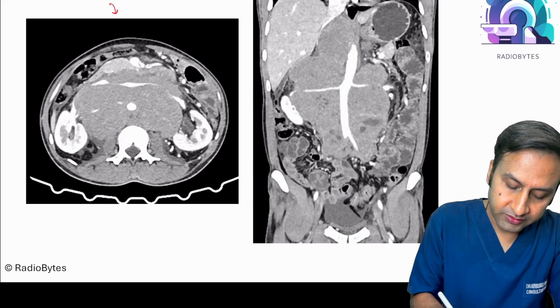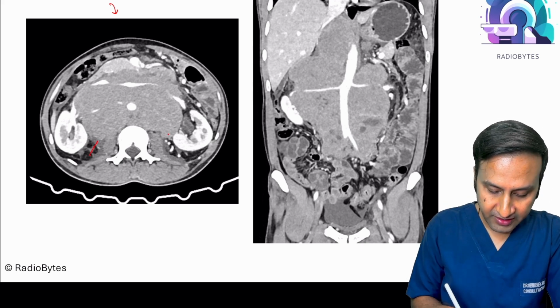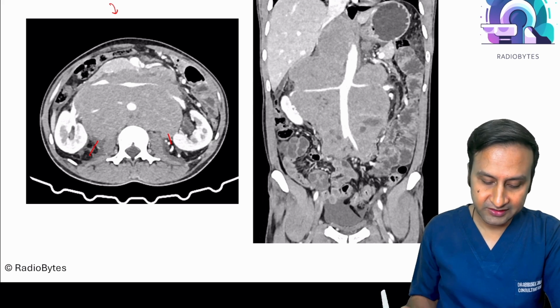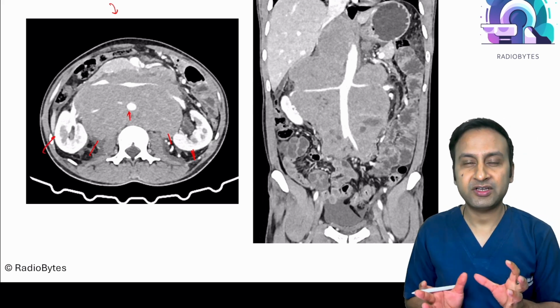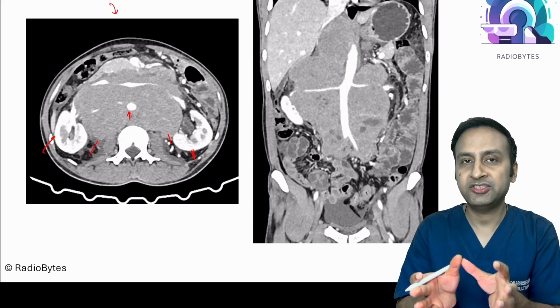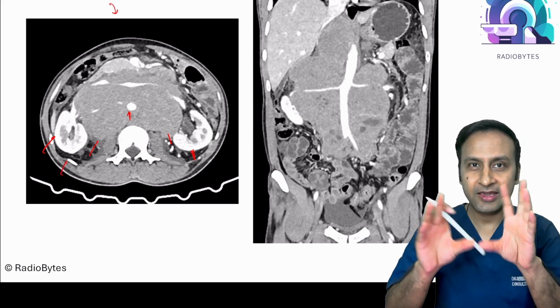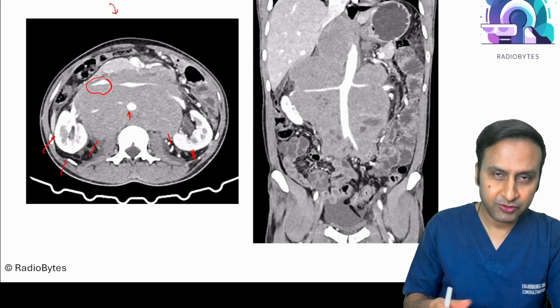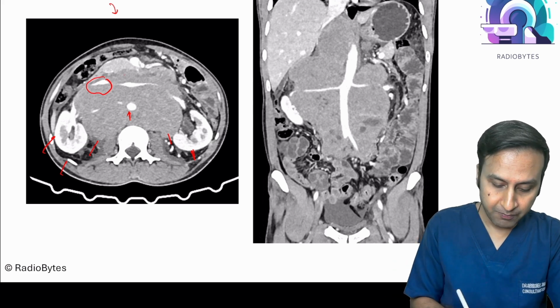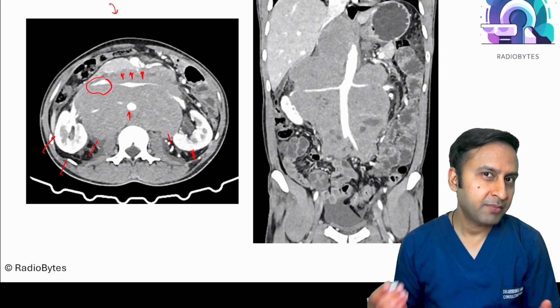So these are the most important cine images. What you can see here: again, we can see that this mass is retroperitoneal. Why? We've already discussed this, because the aorta is anterior. We can see the kidney is also showing mass effect. Now, because the aorta is being pushed anteriorly, the renal arteries are being pushed anteriorly, it appears as if the kidneys are hanging over this particular lesion. You can also see that the IVC appears to be floating in this lesion. The pancreas is displaced anteriorly, something we expect a retroperitoneal mass lesion to do.